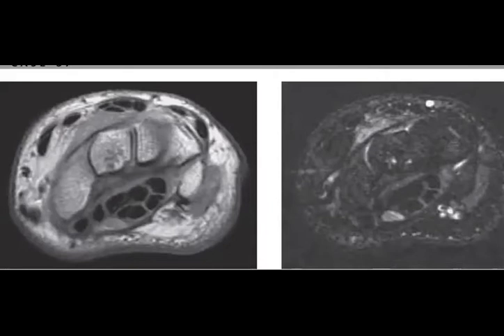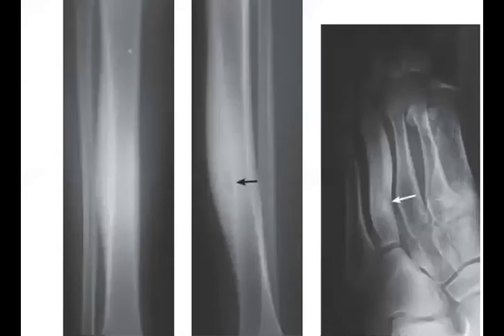Okay, I think it's a bit of a hard case, so let's start with something easier. I hope it can be easier. Okay, so what do you think about this appearance? How do you describe it?